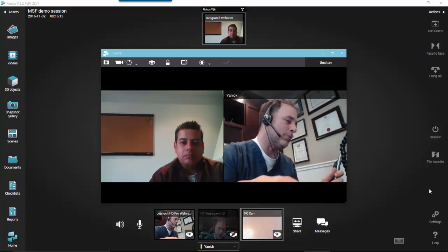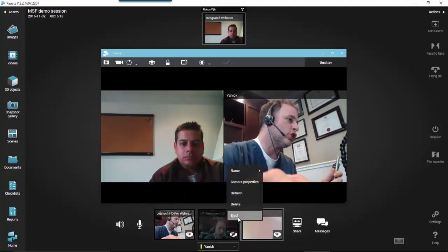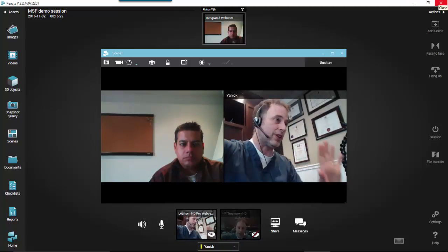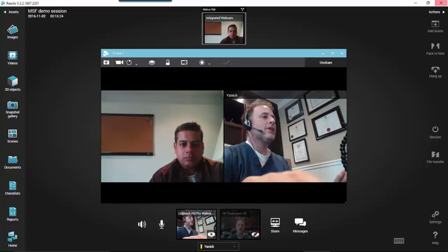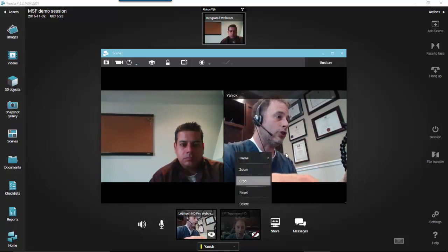The best way when you remove a camera is to go on the camera feed, right-click, and eject it. It's a bit like when you're removing a USB stick, so that you avoid having problems. Now if I would like to review the image I took with Al, I could do one of two things.